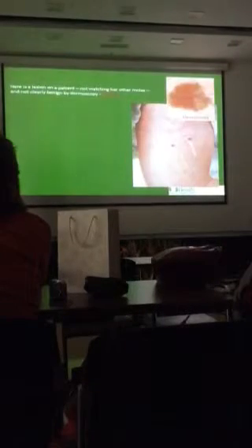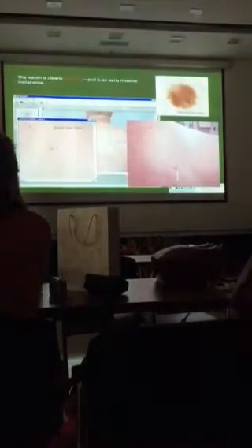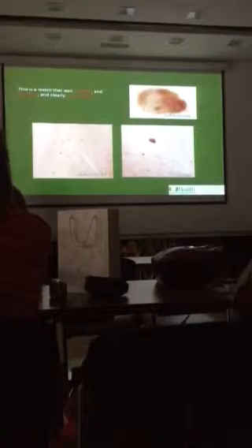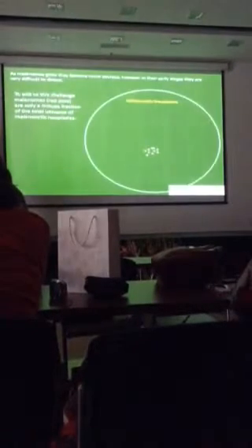an early melanoma. This one I did show earlier, a lesion a little bit dermoscopically off. When you go back, clearly changed, in situ melanoma. This is that one with a little bit more non-uniform features, clearly changed, and invasive melanoma. And then as they get bigger, they become more and more non-uniform, easier to detect. So let's put this together as far as the universe of melanocytic neoplasias.